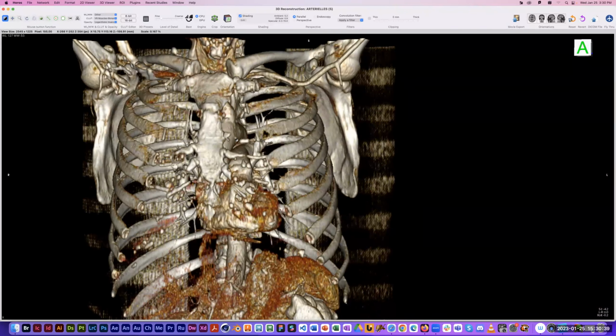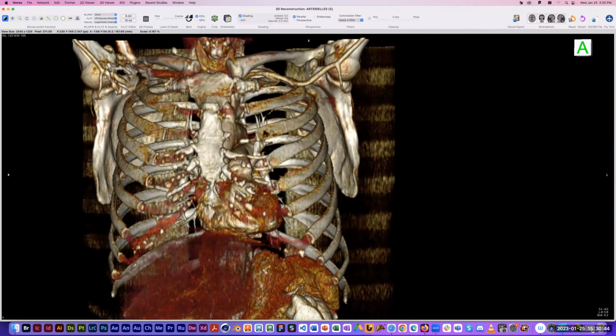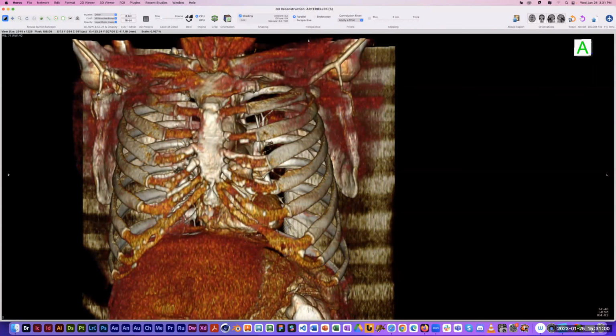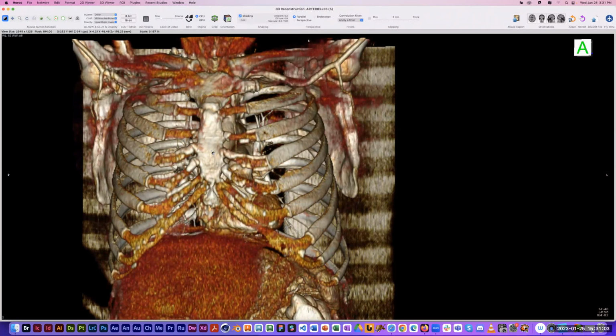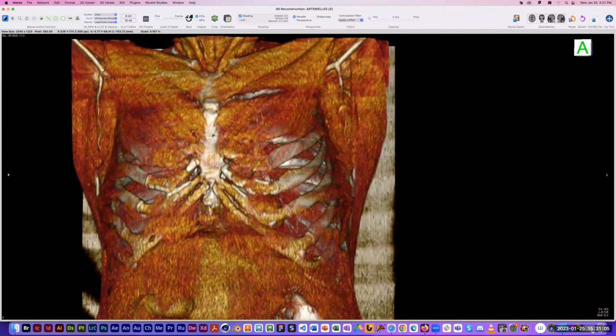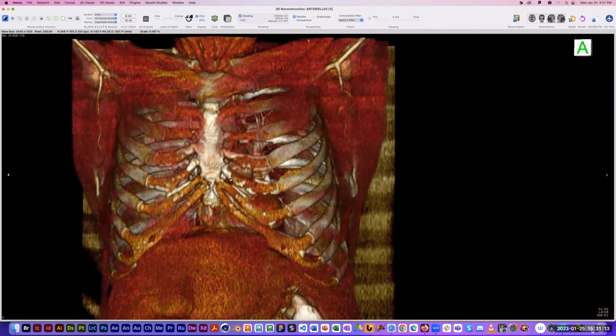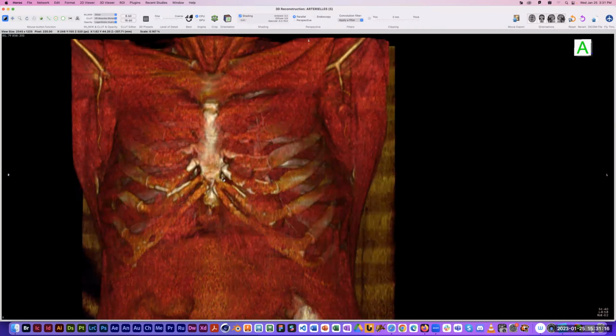But when you open a data set and you start playing around with this, just play around with that window level tool. Dragging vertically up and down and dragging horizontally left and right are doing two slightly different things. It's almost impossible for me to explain it to you now, but in a few minutes, I'm going to show you something else that'll make that difference a little bit more obvious. Why is it that moving up or down or left or right is changing not only the transparency of tissue, but also the color of tissue? I'll try to make that clear for you.